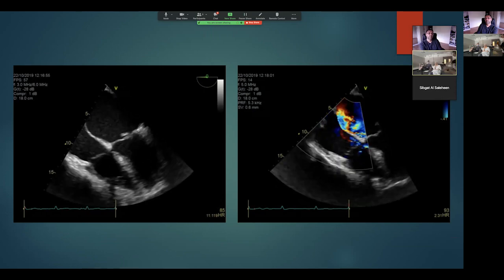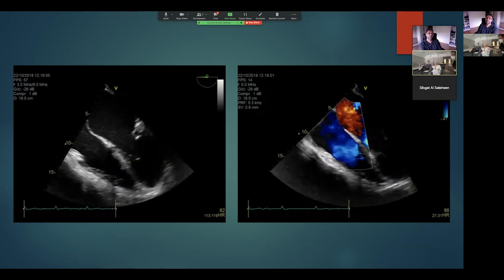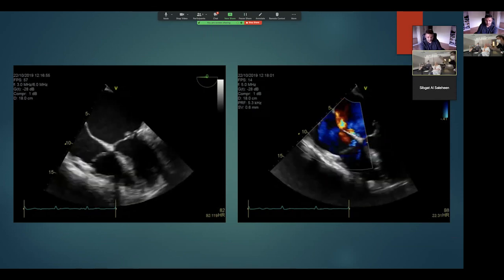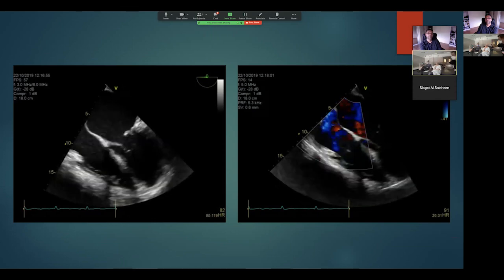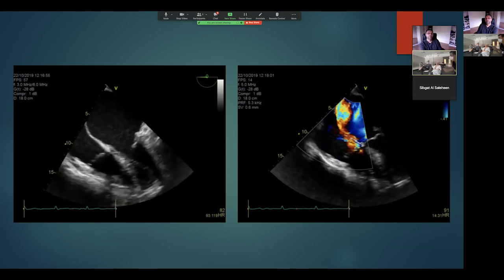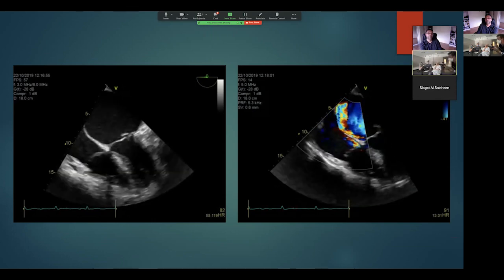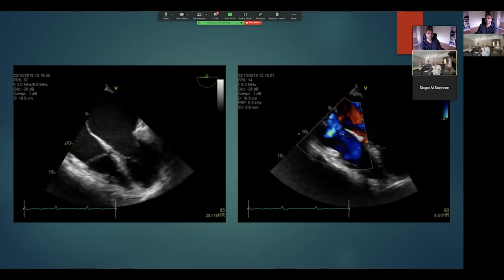Yeah. So the Coanda effect is the process where blood flow sticks to a side wall, and therefore you don't get a lot of turbulent blood flow. Okay, so the buzzword when you're seeing an eccentric jet: you can't rely on the color Doppler because of the Coanda effect. Okay. Thanks, Vishal.